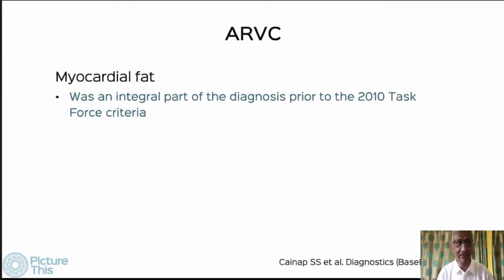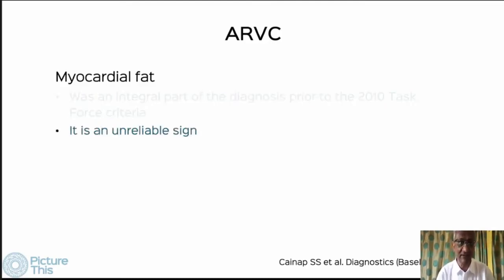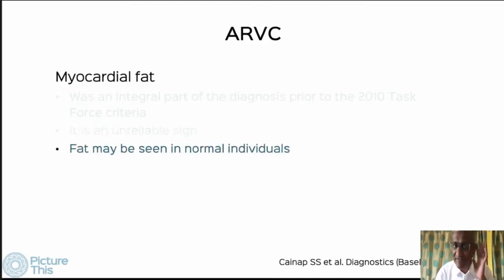What about myocardial fat? So when I was training many years ago, it was an integral part of the diagnosis as far as the 94 criteria were concerned, but it is an unreliable sign.